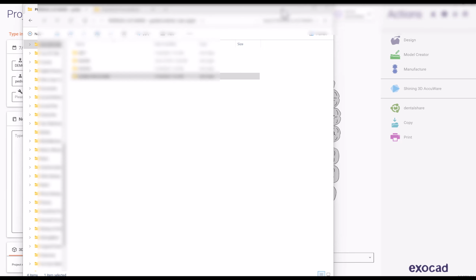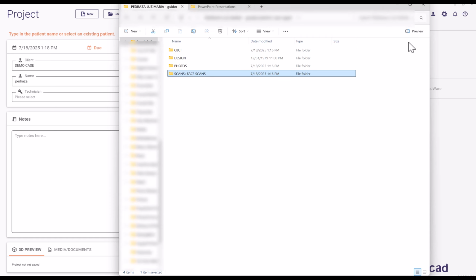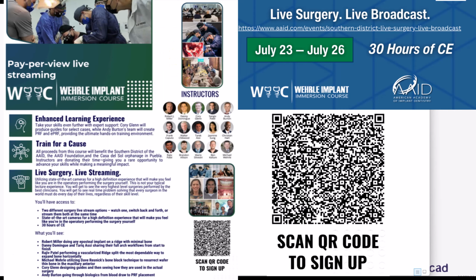All right, I'm going to upload another case tutorial. So this is another patient that we're doing for this AAID All-Star course down in Mexico.